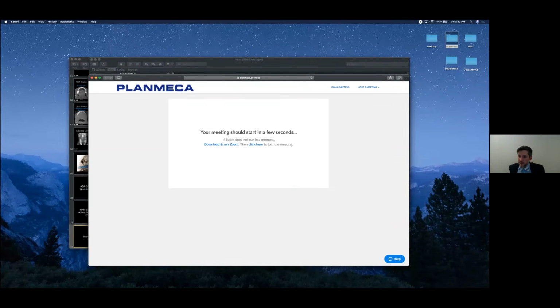Someone said, can this technology help with endo and seeing canals? Yes, it definitely can. You can find canals really easily. The best way to find canals is in the axial view, especially those MB2 canals in maxillary molars. If you take a small field of view of a maxillary molar, you should be able to find those missed canals. Sometimes you can see really calcified, sclerosed canals as well. So the technology really does help for that.